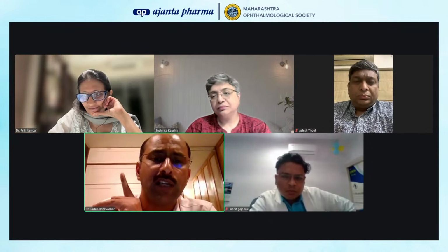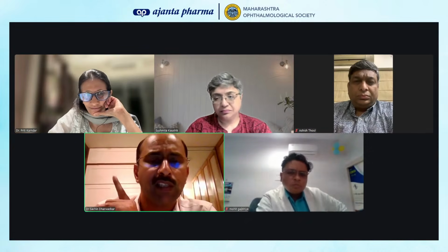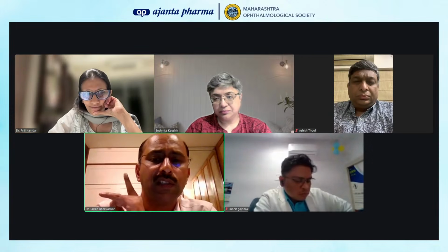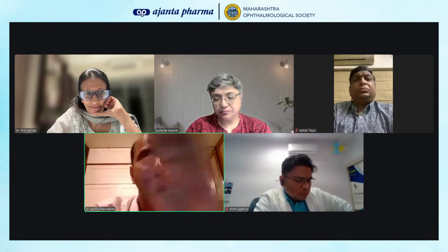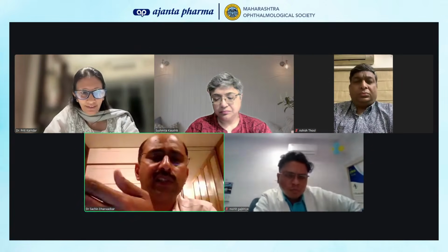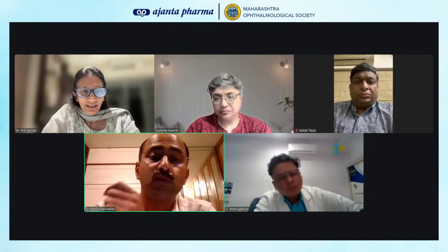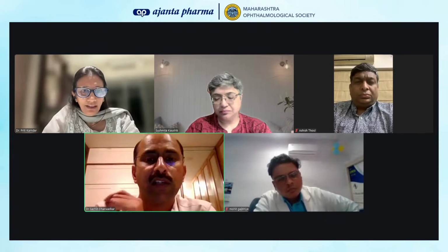2.5 microns is the lateral and axial resolution of a Spectralis. So as I said, twice more than your normal standard deviations would be what I would take. But I'm not saying that everybody should use this. As they have said, you can use your clinical judgment, because if you want to use these parameters, you have to be extremely good with what you're doing in terms of imaging.